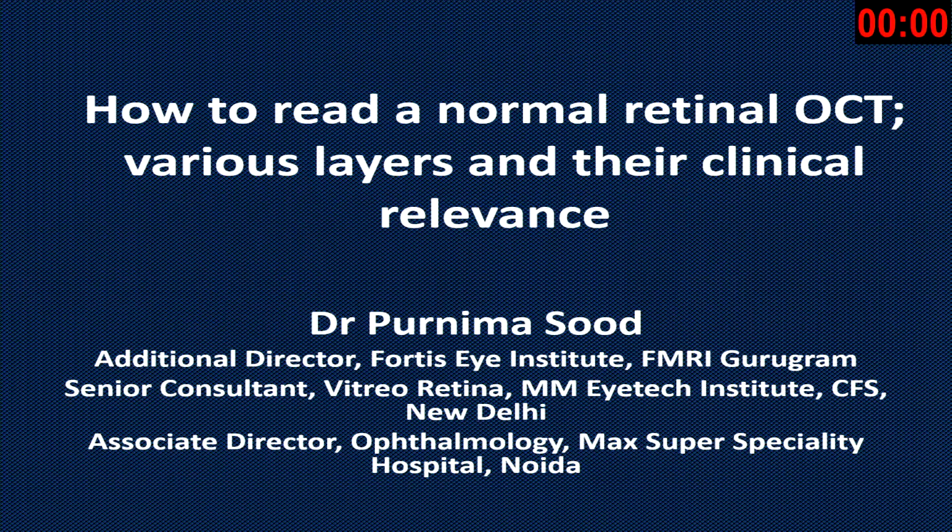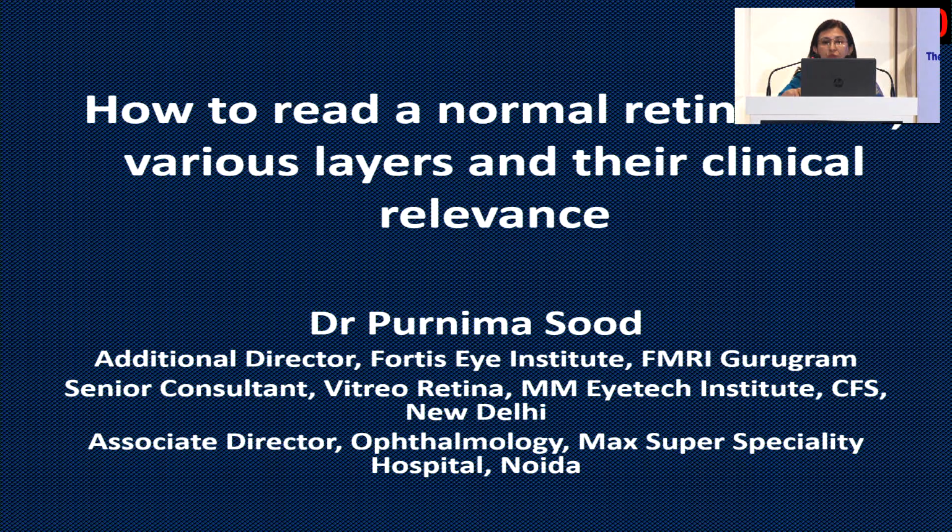I'll be talking about what we look for in a normal OCT macula, what features we can see, and what they mean. I'll be talking about the basic features, and then Dr. Talwar will talk about which disease will have which features.